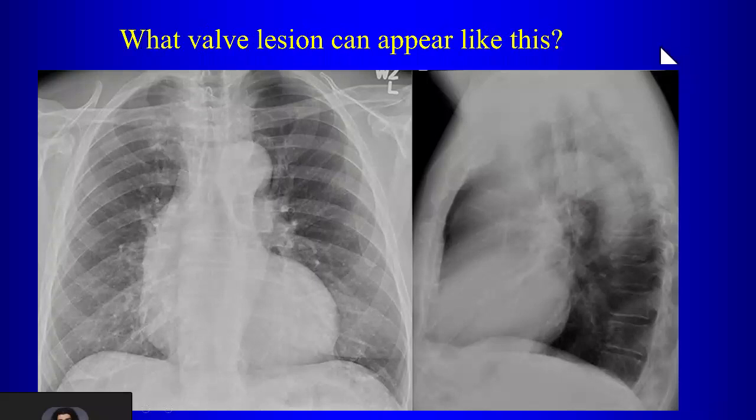What's abnormal on the chest radiograph here? Okay, so the ascending aorta is what? Prominent, shifted to the right. Yeah, tortuous or dilated. What about the descending aorta? So that's also tortuous and dilated, right? So we have, looks like dilatation or tortuosity of both the ascending and descending thoracic aorta.